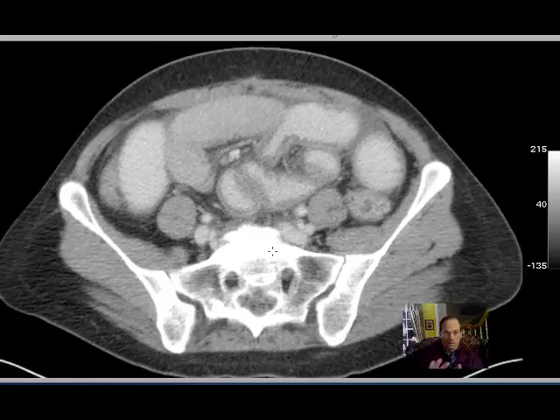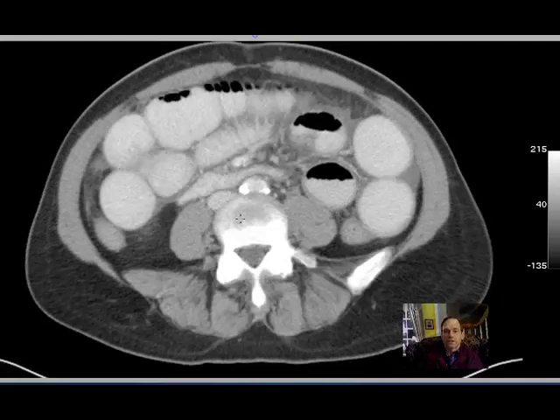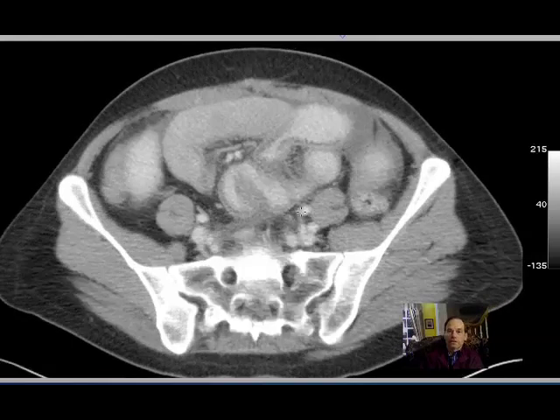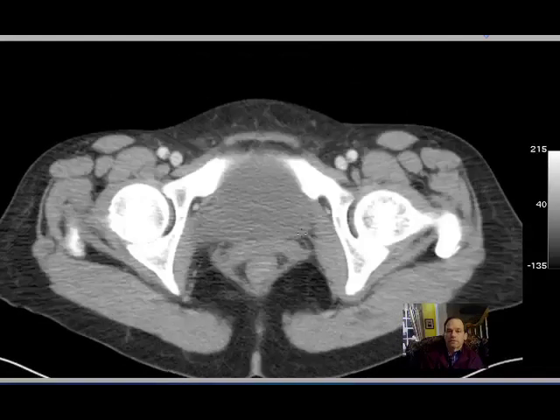Now this is another example. If you look here and say, oh my goodness, how can I ever look at this and know what is the external and what is the internal iliac artery, or even that it's not the common iliac artery or the vein? It's all about anatomic relationships, and you would have to see the bifurcation and follow the common iliac artery out to the branch point and see that, oh yes, one is going anteriorly and one is diving deep, and that's the external iliac artery, and that's the internal iliac artery. It's all about anatomic relationships.